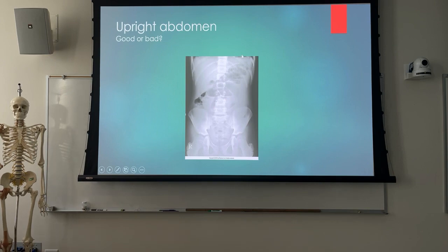Yeah, I can't see the diaphragm, so depending on the doctor's protocol, it could be good, could be bad, except you got a little bit too much of the symphysis pubis. The next time I shot an x-ray on this patient, I'd probably collimate down a little bit more to get rid of some of that.